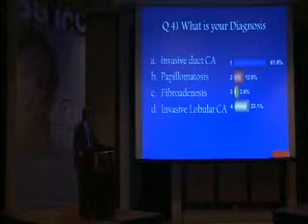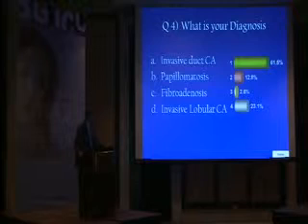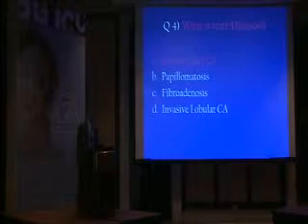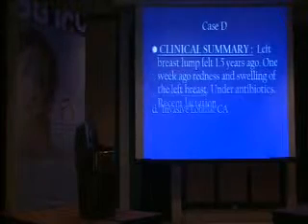Okay, 61.5% for invasive carcinoma, and yes, actually this was the right answer. I think this was quite easy for most of you here, and it has some of the classic features by MRI. Okay.